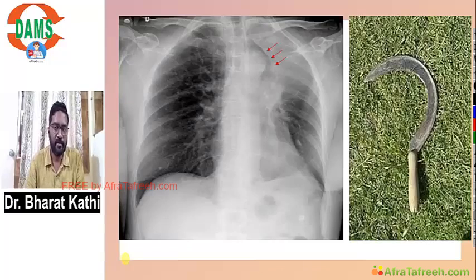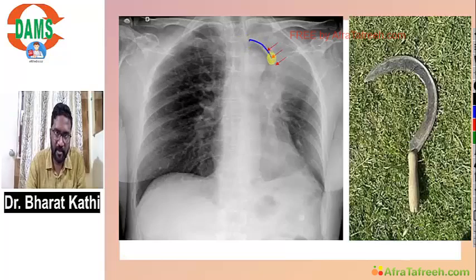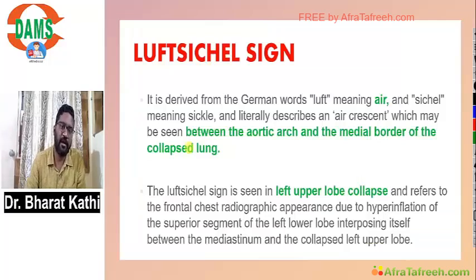Now I have given two images. Tell me what this sign is called. Can you notice a tuft of air, similar to a sickle? So this is called the luftsichel sign. It is derived from German words: luft means air, sichel means sickle.